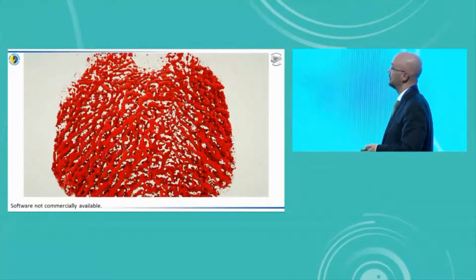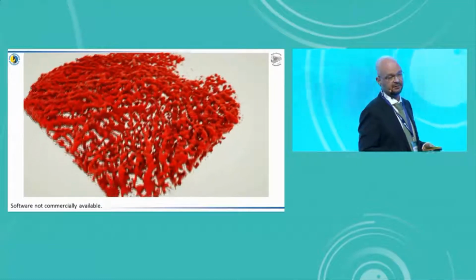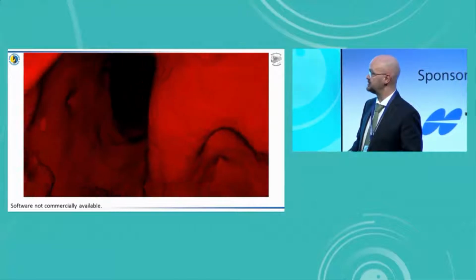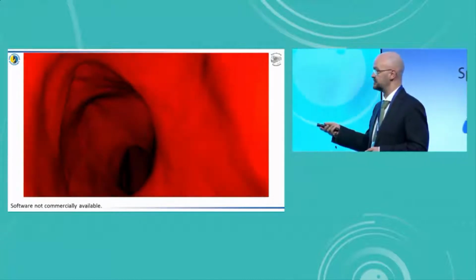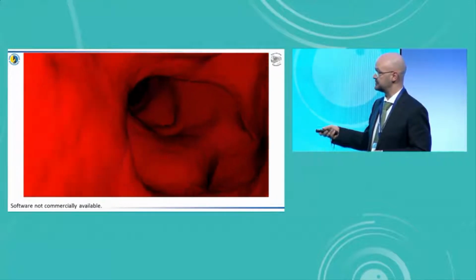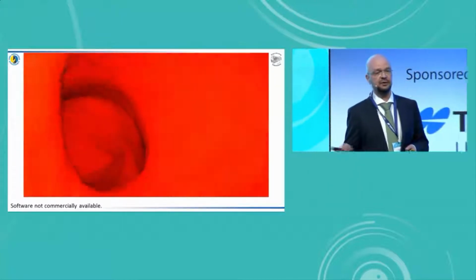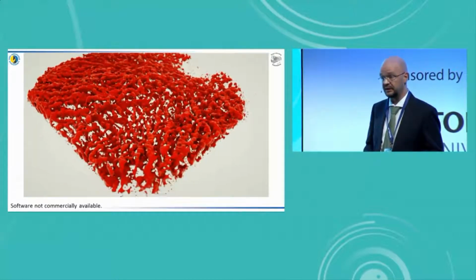Sorry. And just like before, it's possible to take that information and to create a triangle mesh segmentation of it, just like I had done with a choroidal neovascularization. So in this case, this makes it possible to fly through the single vessels and see what's going on. So these are the actual vessels of a patient that came to our clinic, something I was doing with Professor Drexler. Now you're looking at this and you're saying, oh, this is a neat picture, but it has clinically absolutely no use whatsoever. And I agree with you completely.